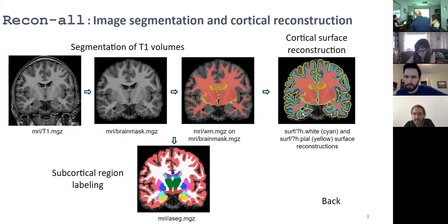You'll actually see some of that in the T1s, and you'll see where it'll lop off. So in the Suen study, there are a lot of brains where a bunch of the anterior temporal lobe, the temporal pole, is missing or blocked. A lot of it is omitted.